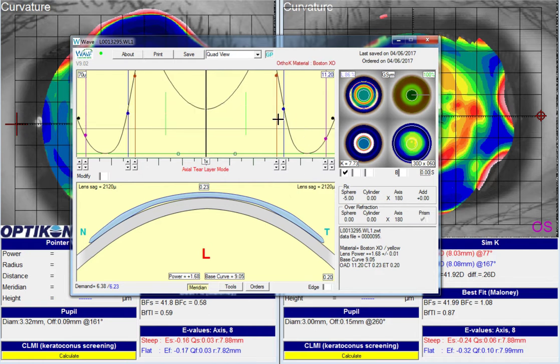Okay, so now this lens at the blue point is about 17 microns taller. But at the pink, we're at 1842. We started at 1816, so we've actually gained about 26 microns there. And since the edge lift was already pretty low, now we're going to have even less. So I'm going to lift out here so that we also get a net change of 17.